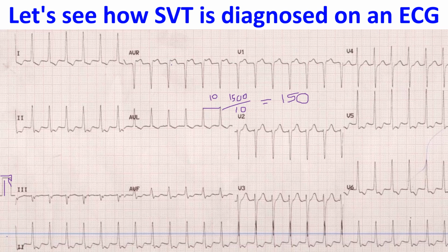Another interesting thing here is this line here. What is the meaning of this line? Usually this would indicate that the ECG paper loaded in the machine is nearing its end and would need replacement. Otherwise there is no reason for this line to appear. It is not part of the ECG recording.